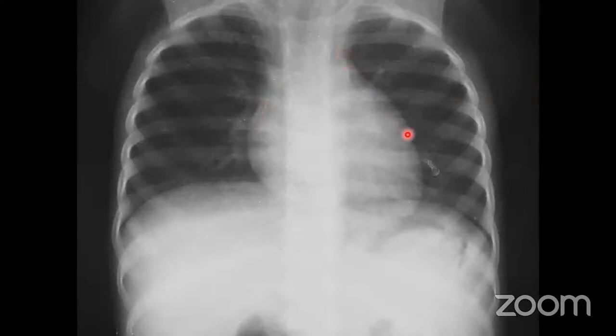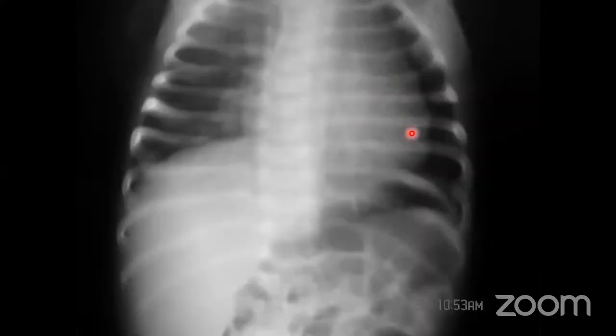Here in the left border, you can just see the notch. This is the notch. This is the notch. Left border, if you just follow it, there is a notch over here. So if the left lobe of the thymus is enlarged, we get the notch sign. But here, the left border of the heart looks wavy. This is another presentation of the thymic enlargement. So I have shown you different types of thymic enlargement.